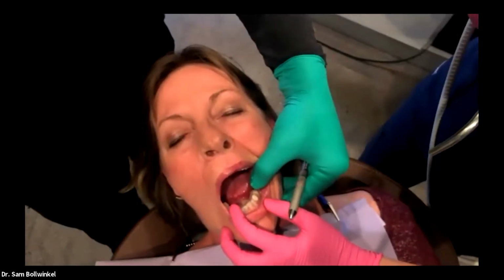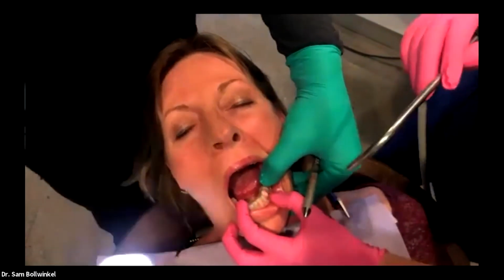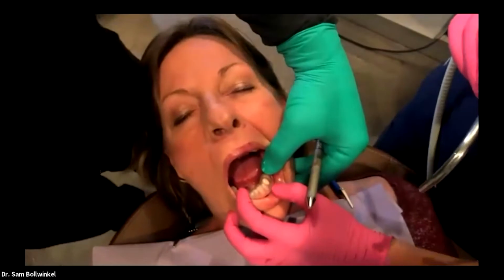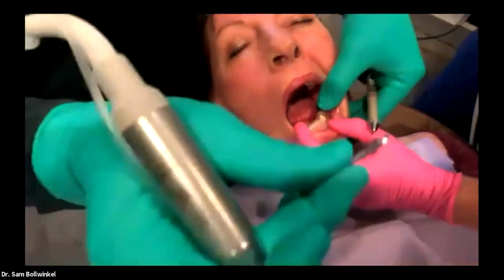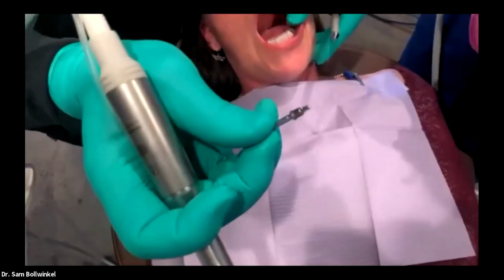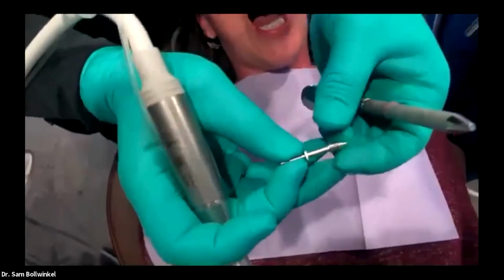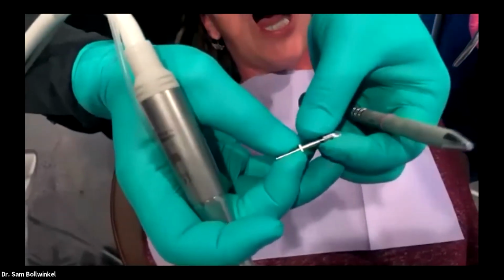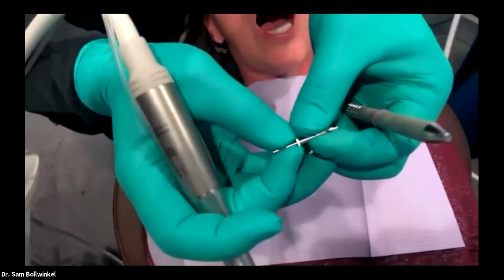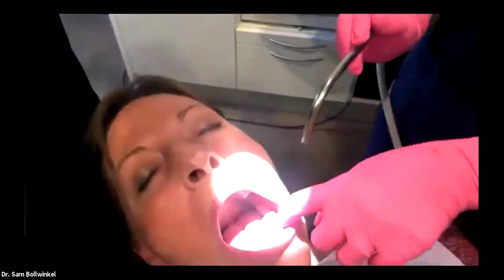So what we need to demonstrate with this as well, which is super cool, is let's do this real quick. This is a sleeve-on drill system from Astra Implant. Instead of having a surgical key set, my sleeve just slides up and down on the osteotomy drill itself. So I don't have to use the second hand to hold the key inside my guide. The guide is there, so you can see as we go back to here, if it's not too bright.